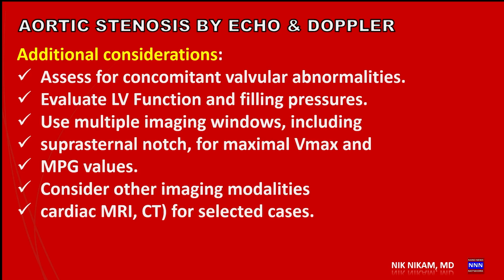Echocardiography will be the central focus in identifying patients with critical aortic stenosis, the degree of aortic stenosis, left ventricular function, right ventricular function, and other associated features. So that will help us to determine if we are dealing with an aortic stenosis that can be handled with a TAVR, or whether the patient needs to go for aortic valve surgery, or they can be just followed up medically based upon all these different parameters put together.